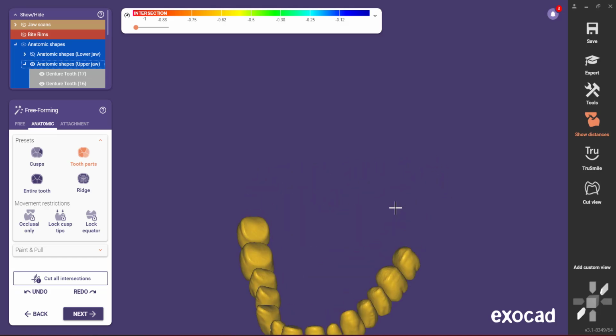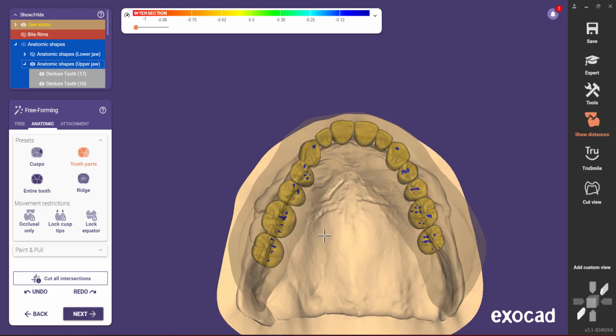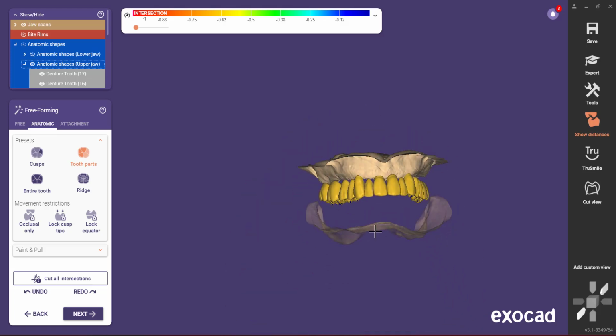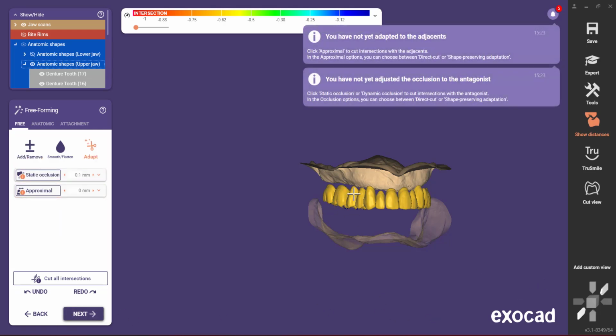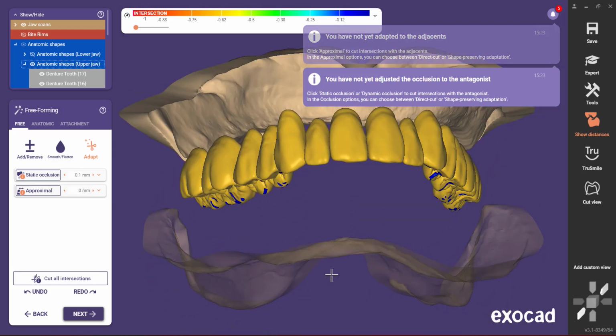Good enough for a demo. All right. The asymmetry part, I don't love it. Now that I'm just seeing that, I would go back to the former stage where we had the chain functionality. But in doing that, I'm going to lose all this stuff that I've just done. You know what? For demonstration, let's just move forward with it. This is new enough to me that I haven't mastered the way that all the functionality plays nice with one another.